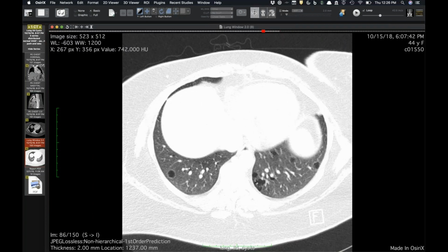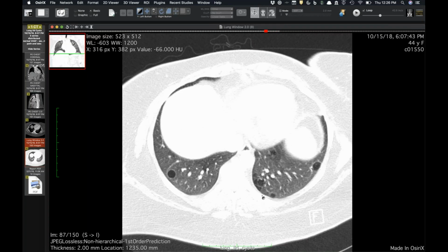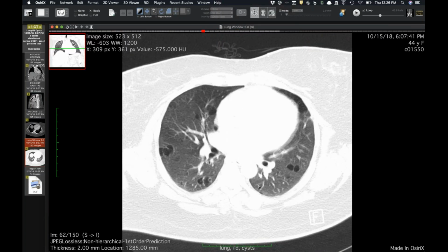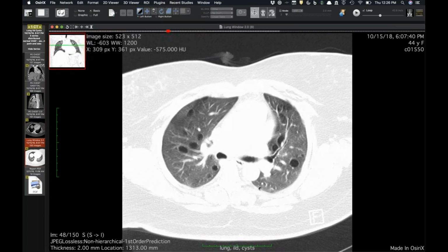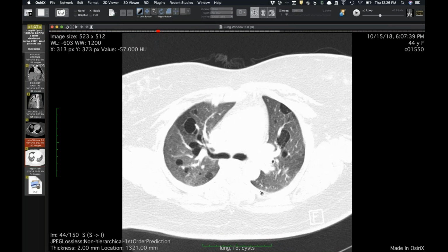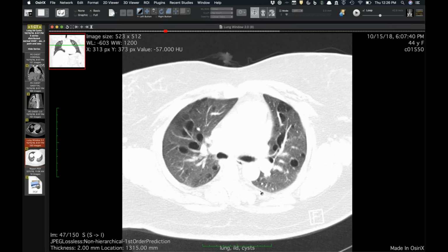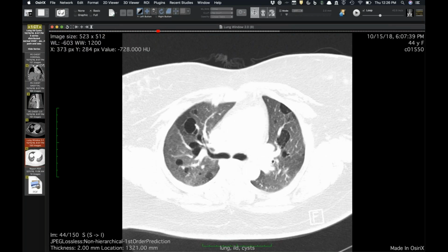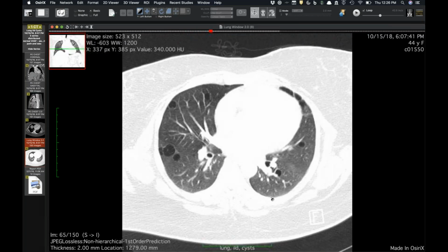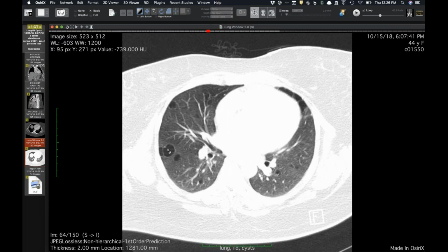Because I think some of these have more of a lobulated perivascular look, and I know you can see that with LAM sometimes, but they're not really that random. They seem to be more clustered. I was just curious what your thoughts would be on this. They're more heterogeneous as far as diameter goes. Yeah, I like LIP or amyloid light chain much better than LAM.